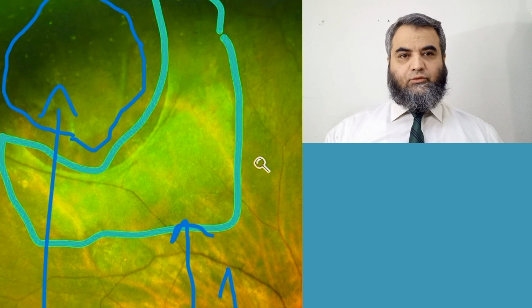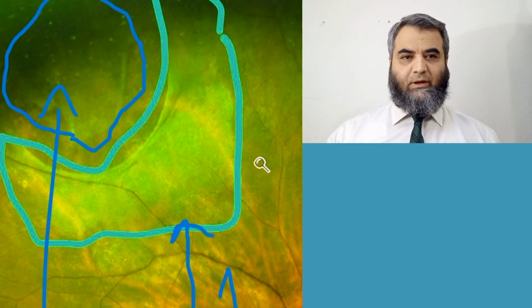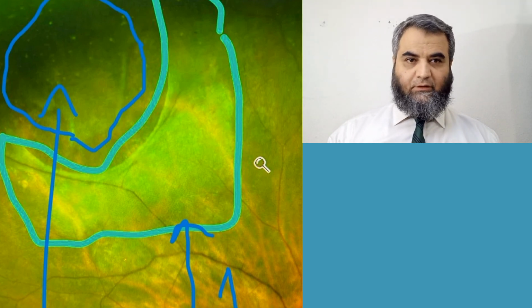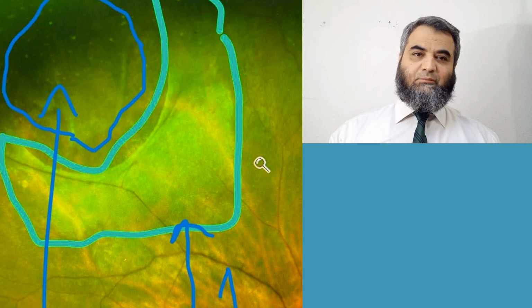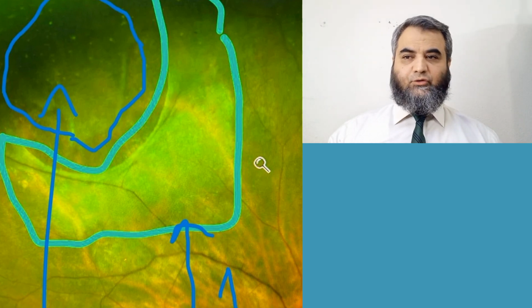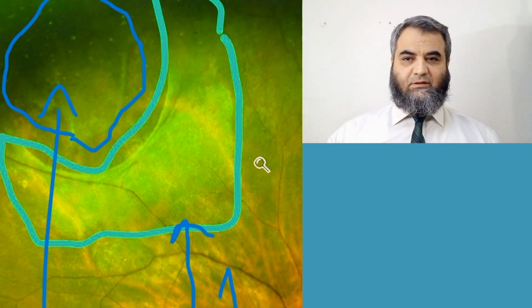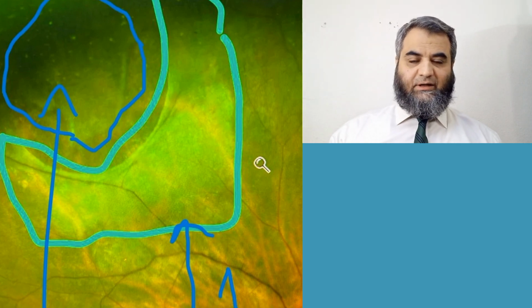So this is a magnified image of the last slide. Here you can see that this retinal tear has a margin of whitening around it, which is shown in number 1, and this whitening may be because of the subretinal fluid or because of the vitreous traction at the margins of this tear. And number 2, which is shown, is a big operculum which is overhanging it. This patient has macula on, so his vision was good. Otherwise, apart from this, the retina was flat.